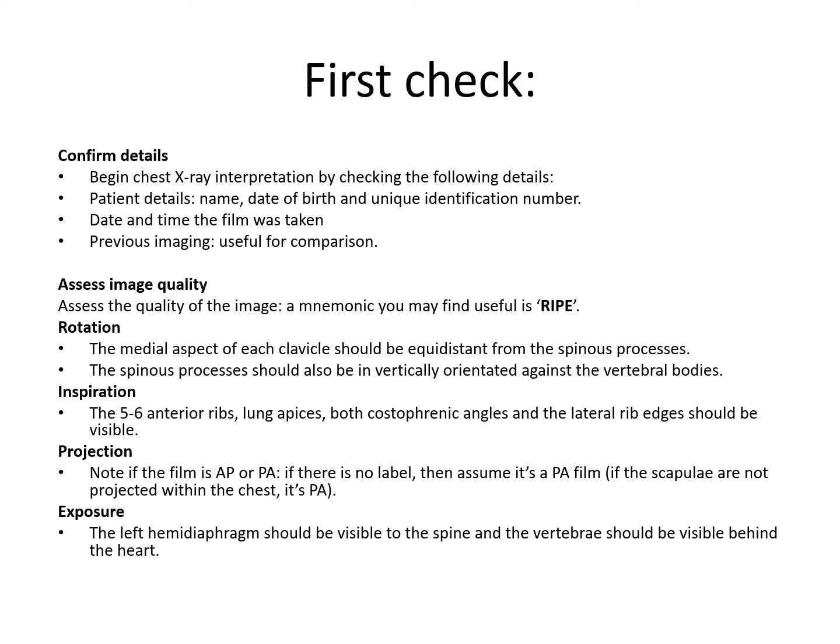The most important thing to note first is that you're looking at the correct patient, the correct time and the correct date. You can see the patient's position, so if they're sitting, standing or in supine.